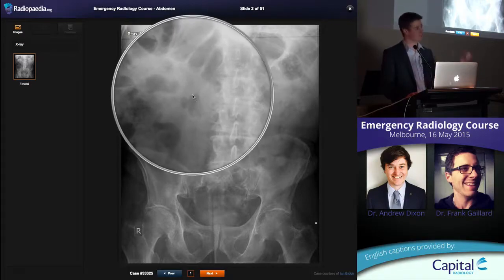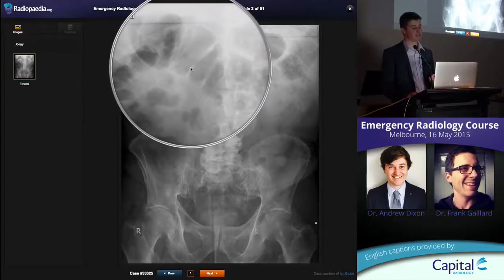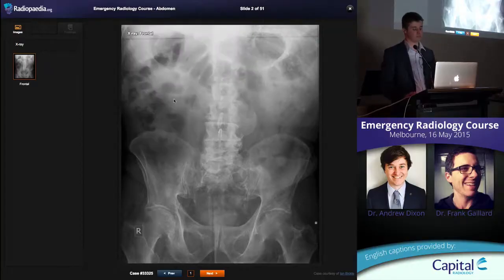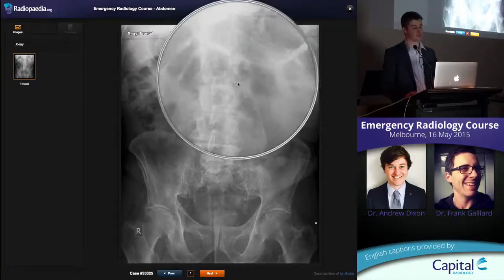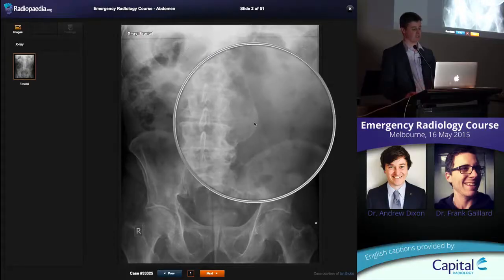But you can't see the interface between the edge of the outside wall of the bowel, okay, because the density between the wall and the adjacent fat is fairly similar. Okay, so you shouldn't be able to identify that. So you look at all these bowel loops and you can only see the inner aspect of the wall. You can't see the outer aspect of the wall. This patient's not completely normal. They have an abdominal aortic aneurysm. You can see this calcified thing coming down here.